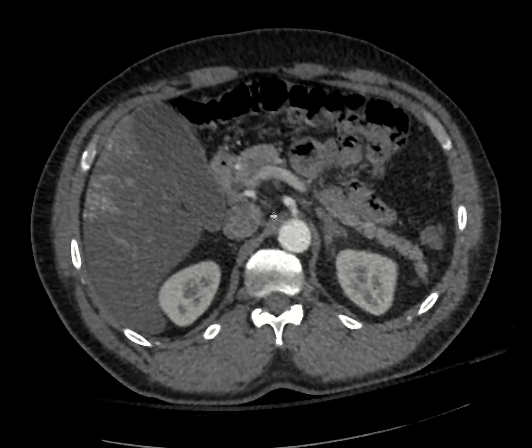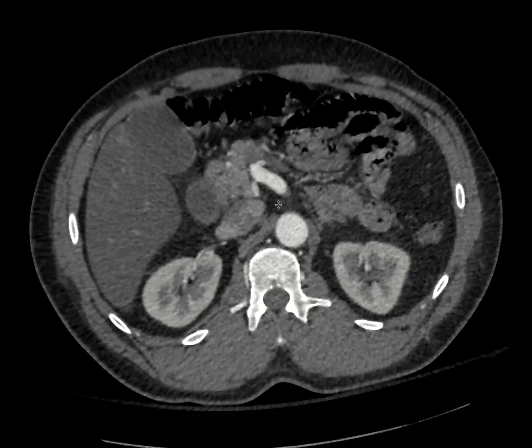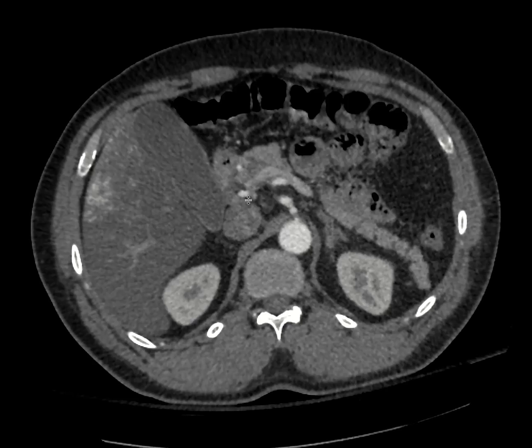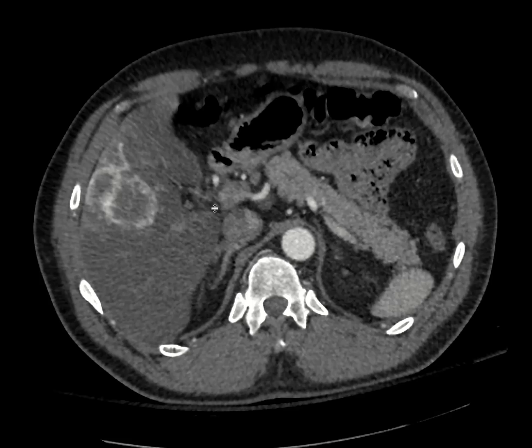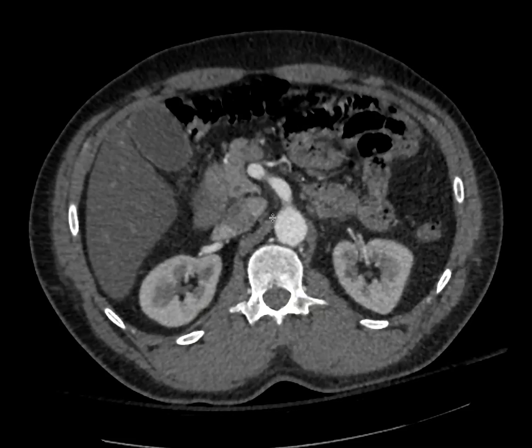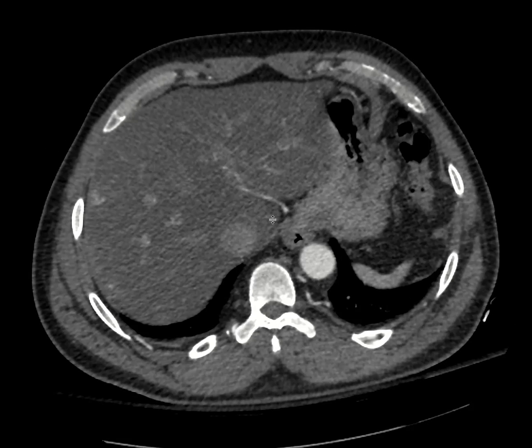The other interesting anatomical variant in this particular patient is if we go to the SMA here, we can see this branch posteriorly emanating off of the SMA here actually supplies the right hepatic artery as well. And so this patient has an accessory right hepatic artery arising from the SMA and a replaced left hepatic artery arising from the left gastric artery.